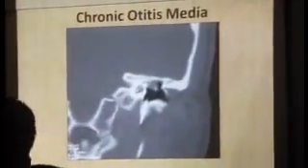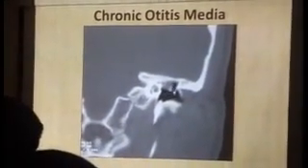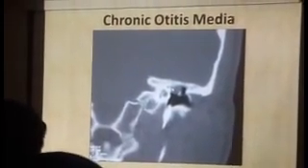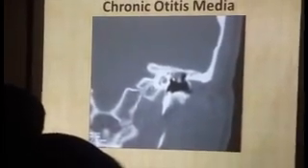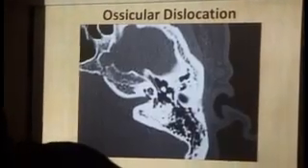So the cobra head appearance would not be associated with the incus. So what is the ossicle we should have expected here? That would have been the malleus, and it is eroded by the pathology. Not only that, look, this is the tympanic segment of the facial nerve. Do you see any bone here? No. So probably you deal with the dehiscent facial nerve secondary to this pathology.